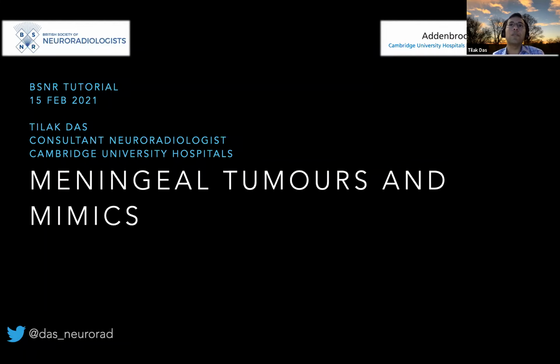You do notice more restricted diffusion for atypical meningiomas, but I've always really noticed that in retrospect, and I'm not sure that prospectively I've actually made that call before seeing the histology. It tends to be more things like irregular borders and too much edema, with the caveat of the secretory meningiomas.